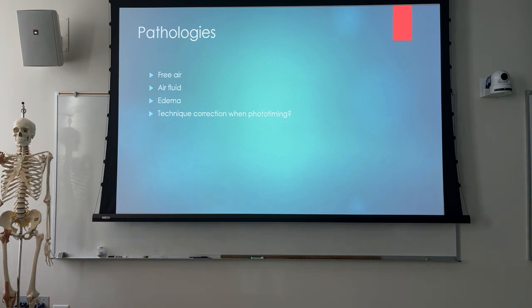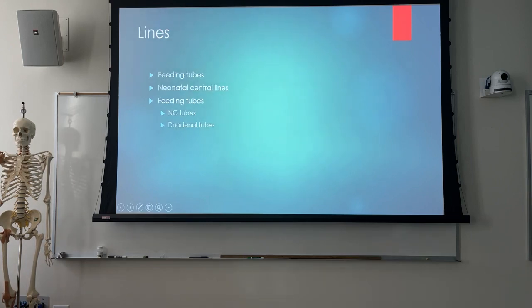If you need to increase image receptor exposure, there are ways to do that, but you can do that just with the positive and negative density settings, or you can change selection of your photocell orientation.